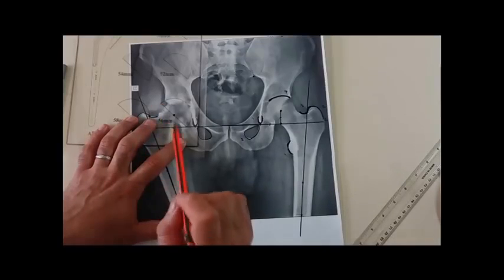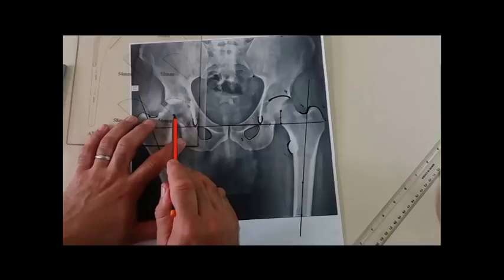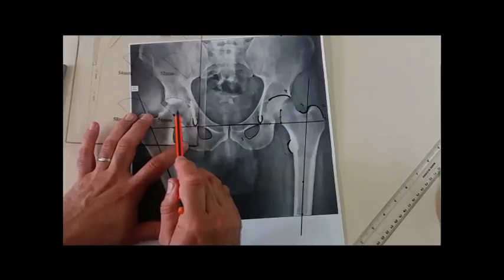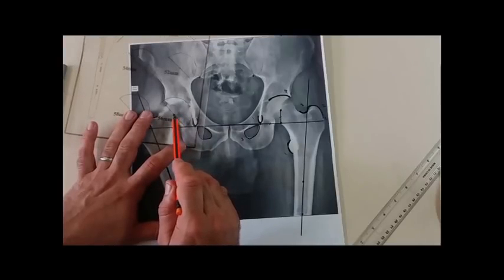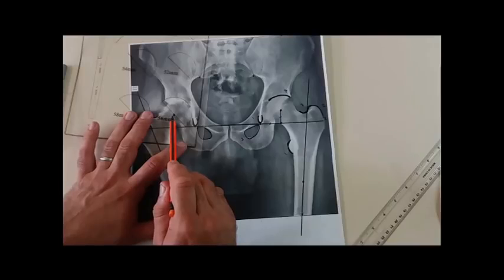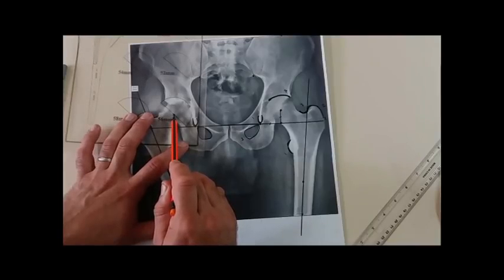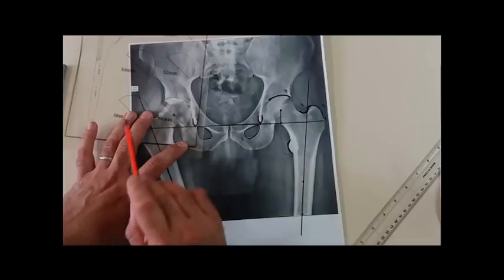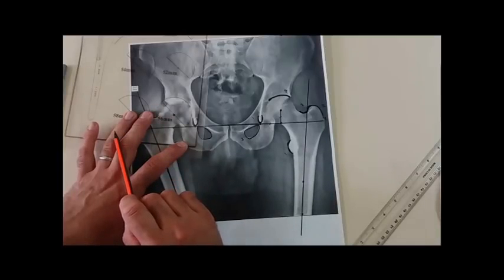This is one solution. Another solution is to incline the acetabular cap in a more vertical way. That's to say, for example, not 45, we can do the inclination about 50. By doing this manipulation from 45 to 50, the uncoverage would be less than that with 45 degrees.